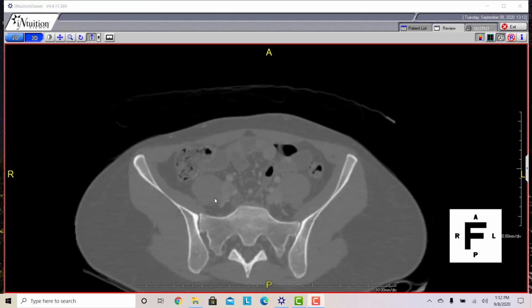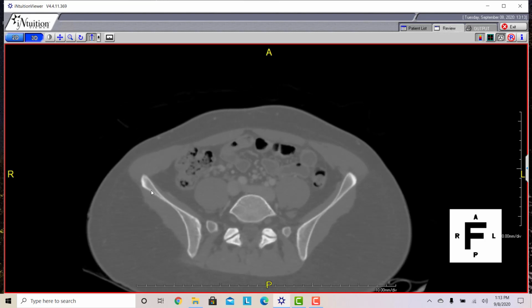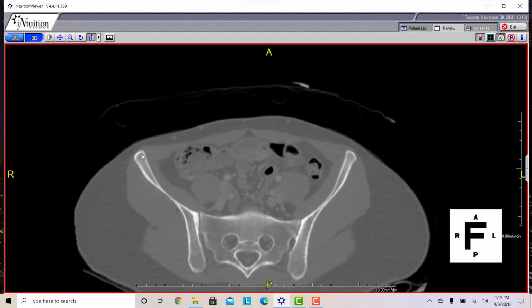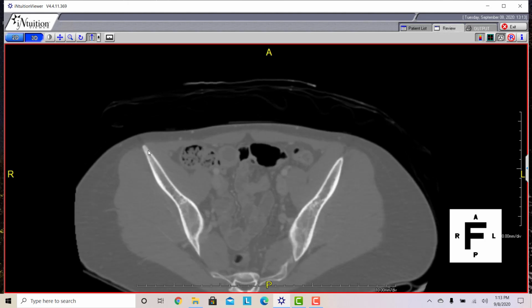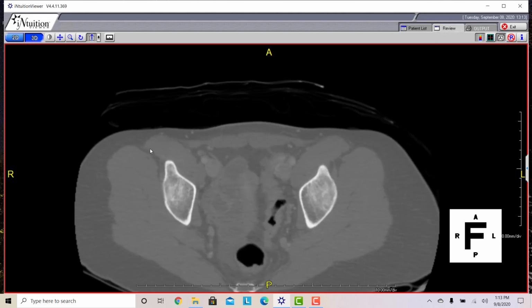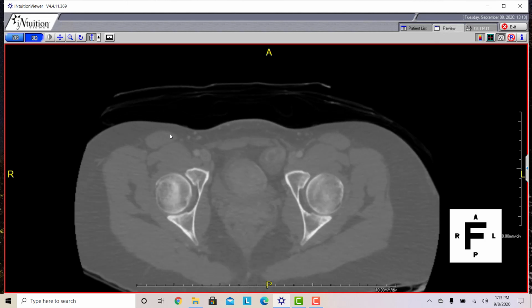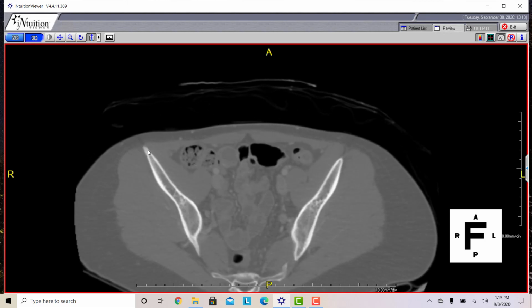Now to find the anterior superior iliac spine, I usually go from the top of the ilium, continuing inferiorly, and then usually the anteriormost point here that's very superficial and close to the skin is going to be the right there. That's the ASIS, the anterior superior iliac spine, which is going to have the tendon of the sartorius muscle attached to it, which is right here. Here's the sartorius muscle. Coming back up, it's going to be a tendon, and then it's going to insert right here on the ASIS.